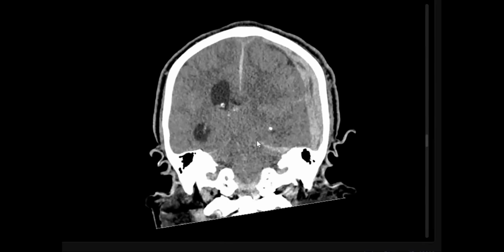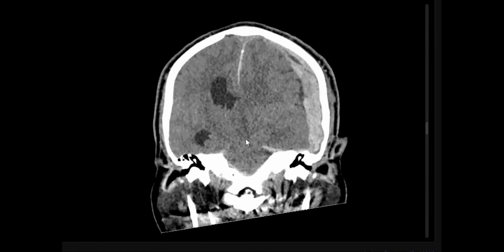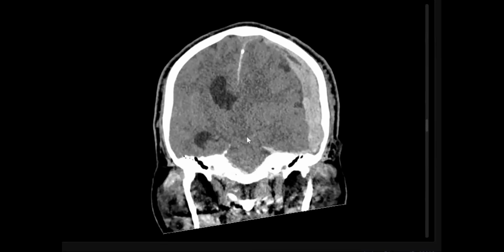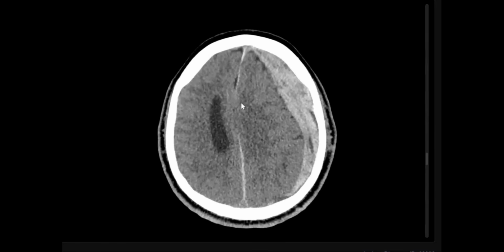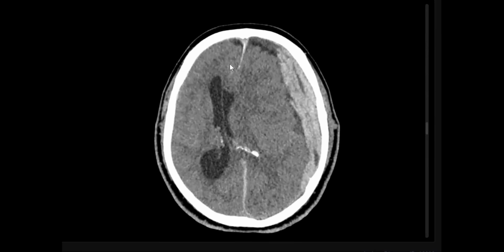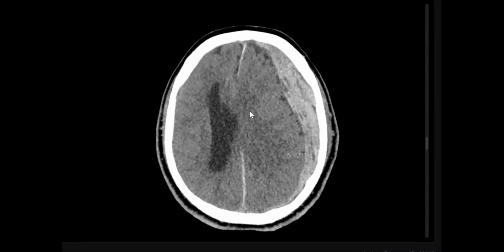And also, it's important to be assessed in the coronal. As the uncus herniates through the tentorium, and the tentorium leaflet, like the falx, is very rigid, arteries can be compressed. Subfalcine herniation, what is the expected vascular complication that may happen? Compression of the anterior cerebral artery, and it may cause anterior or frontal, even bifrontal infarction.